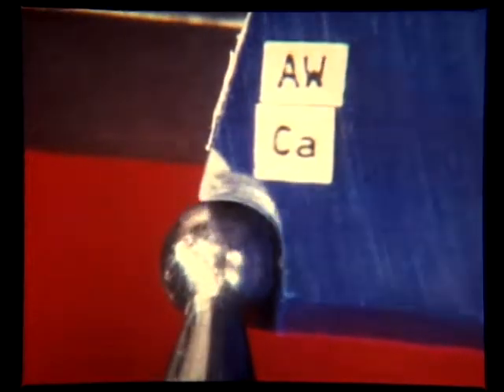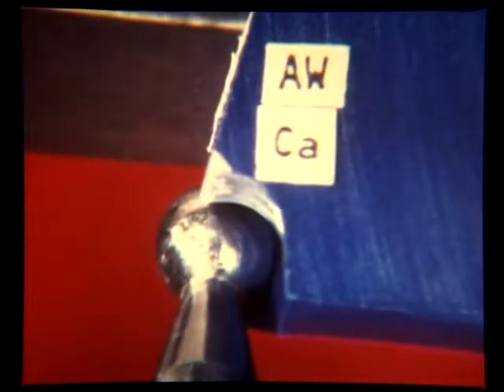When a sectioned analog is viewed in the frontal plane, the condylar sphere during chewing shows how it translates down and back up the eminence in a fairly narrow track, quite different from the angled Bennett guide concept used in early articulators.